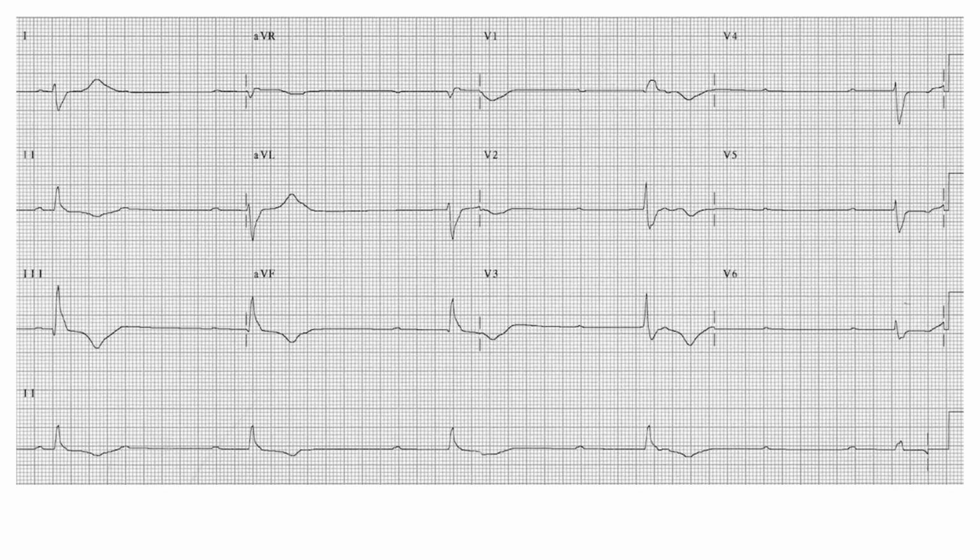Here also you can see wide QRS complexes. You can see the ventricular rate is around 1, 2, 3, 4, 5, 6, 7, 8, 9, 10, 11. So 300 divided by 11 gives the ventricular rate. So it will be around 27. So this is the proper ventricular escape rhythm.